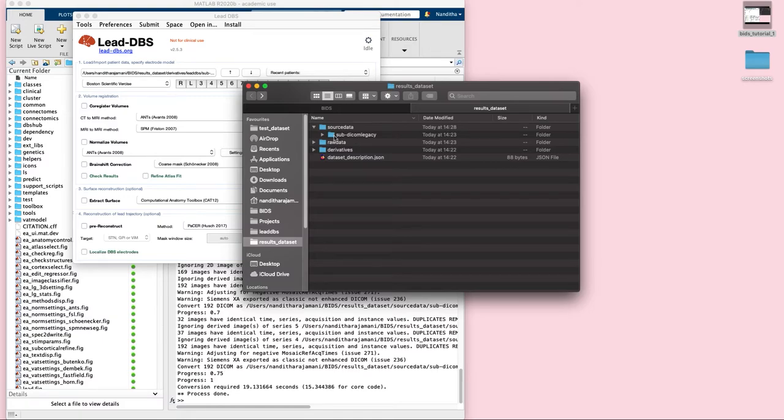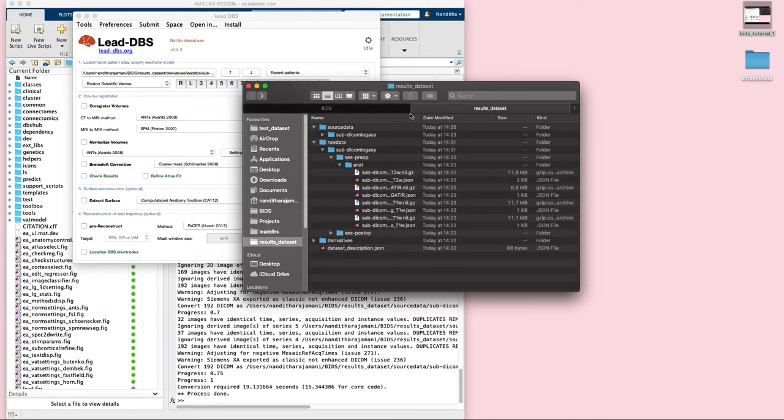Now these raw NIfTI files are inserted into the raw data folder. So the raw data folder also has a subject folder inside, and inside the subject folder is the bifurcation into two sessions, that is the preoperative session and the postoperative session. Inside the preoperative session, there is the anat folder, which contains all the anat files.